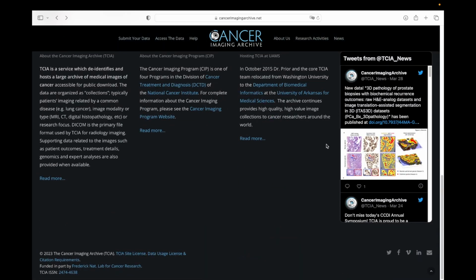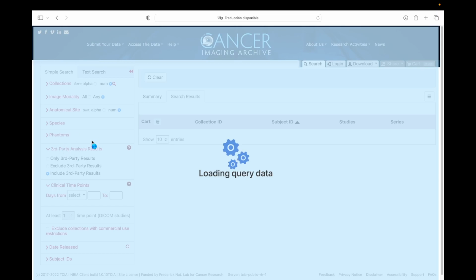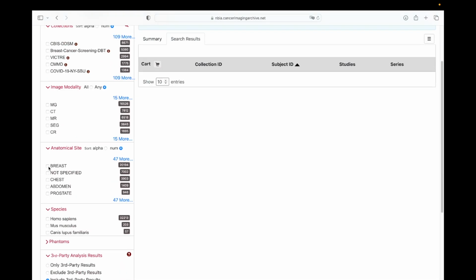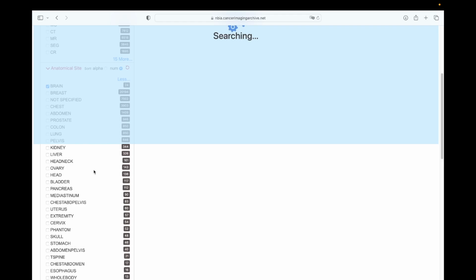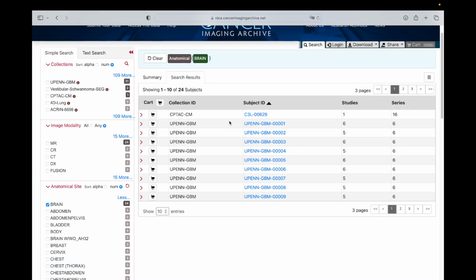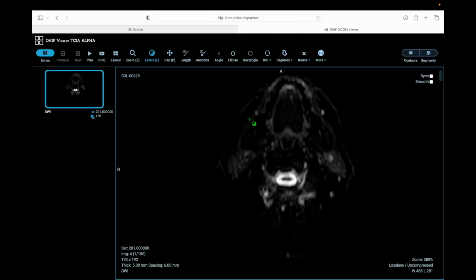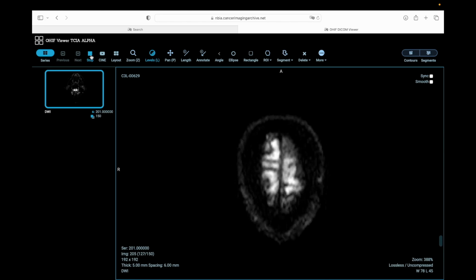The Cancer Imaging Archive (TCIA) is an online medical image archive that hosts a large amount of cancer-related image data. It contains a variety of image data, including computed tomography (CT) images, magnetic resonance imaging (MRI) images, radiography images, and other types of medical images.